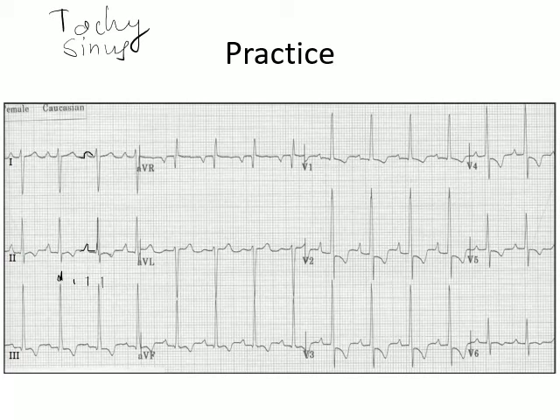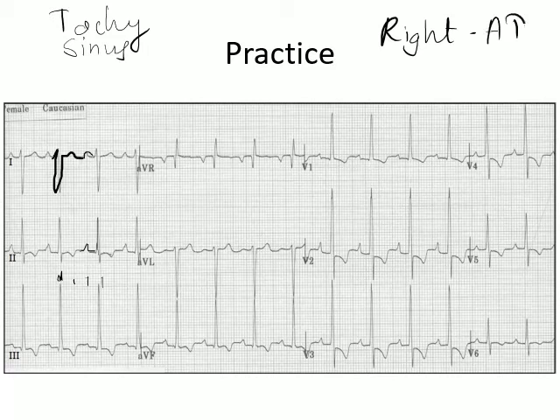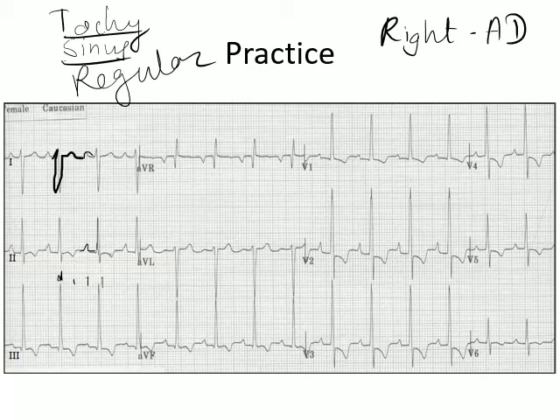And if at all you want to see, you can notice that this patient has a lead 1 QRS complex which is predominantly negative. If you remember from our slide on axis, a negative lead 1 means that there is a right axis deviation. So this is an ECG showing tachycardia that is in sinus rhythm and a regular tachycardia. It's basically an ECG of sinus tachycardia.